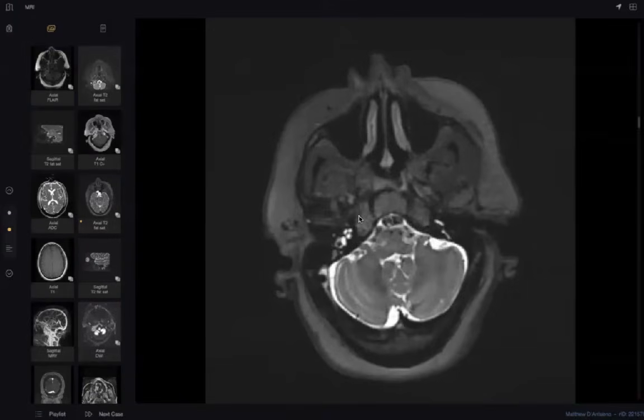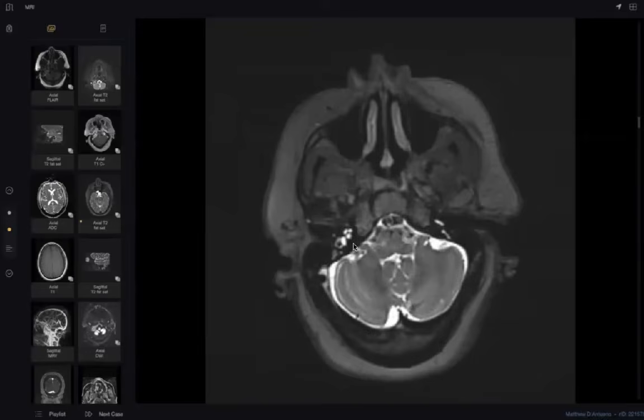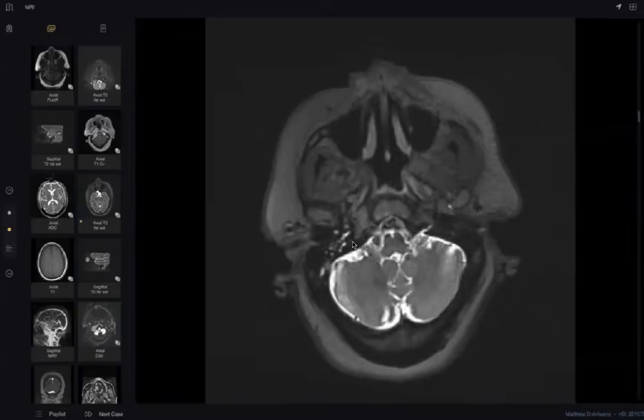How can we get the level of the ear? In T2 MRI it is very difficult, but there is a very easy method, my colleague: either by the nerve, because here this is the IAM, internal auditory meatus, or by the labyrinth. It will be seen very well in T2.